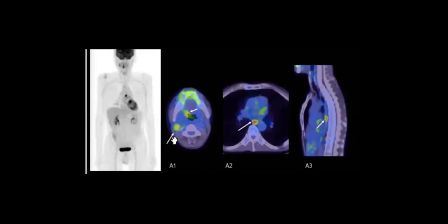And there is again a lymph node here in the right cervical region. So again, when you find lymphadenopathy, search first for the oropharynx. And when you don't find something, okay.